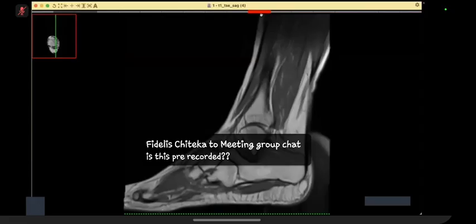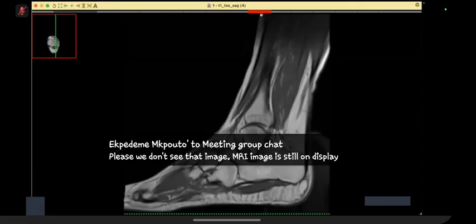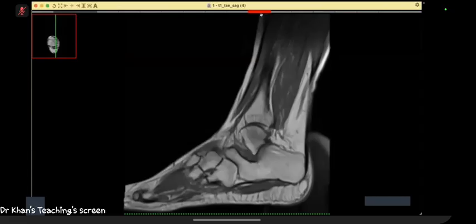Another case which is a gross case because it's bony. Here, you can develop your eyes on another sign. This is the talar beaking, but look at this. This is known as the C sign, and it gives you the appearance of a C. Together, there is a projection of the bony sustentaculum tali as well as the posterior portion of the talus. That gives you the C sign. So you have to develop your eyes on this sign.